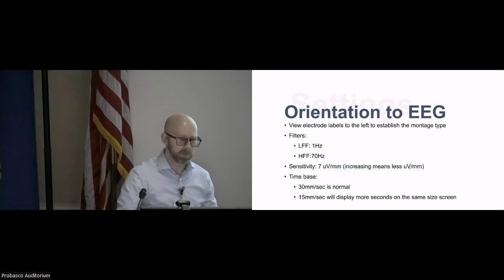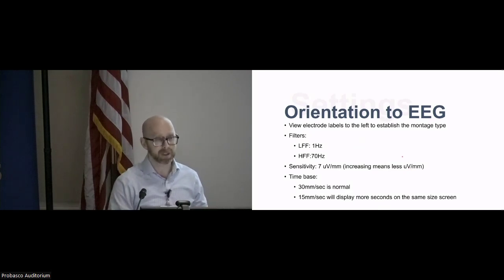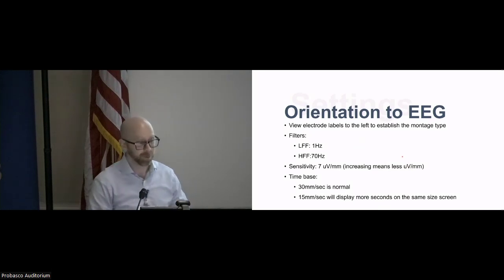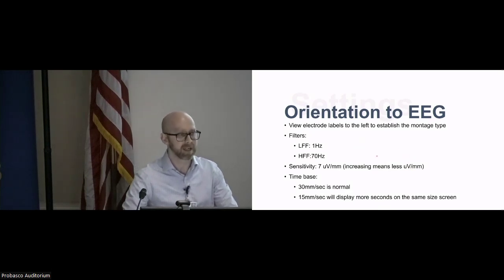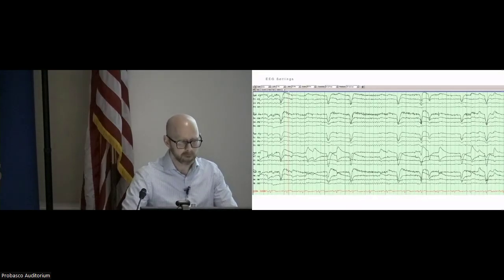The other thing is EEG settings. It's not the most exciting topic, and we'll get through it fast, but it's really important because there are filters on an EEG. If you have them set all wonky, it's going to look way different than it would normally. Sometimes you can really get fooled if the settings are not correct. So these are just the standard settings. You probably don't need to memorize this necessarily, but it's worth at least recognizing the role that plays, especially if you read EEG and you see the settings up here. So it's always good to look.